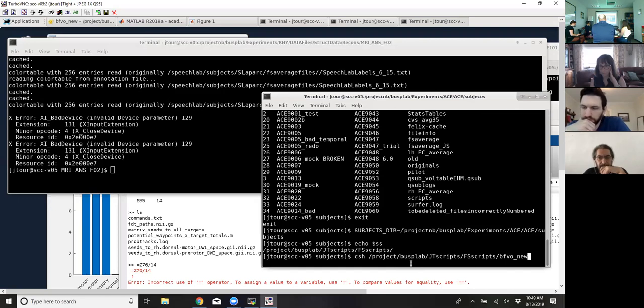So this is a quirk that maybe Alfonso can help me with. Sometimes you can address these variables directly to execute, say, a function, and sometimes you can't. So what I had to do here to make this work is add in this. So this is C shell, CSH.